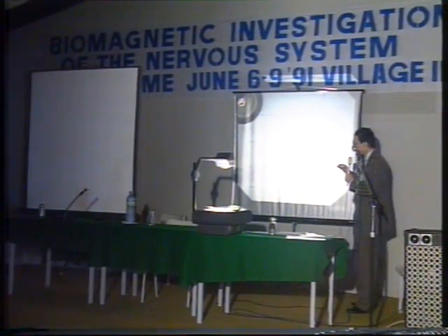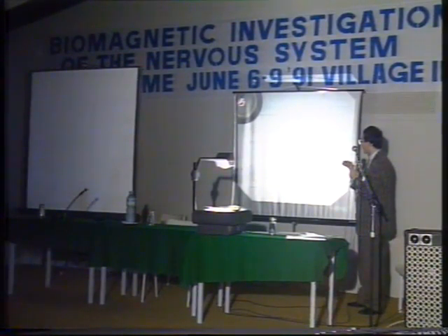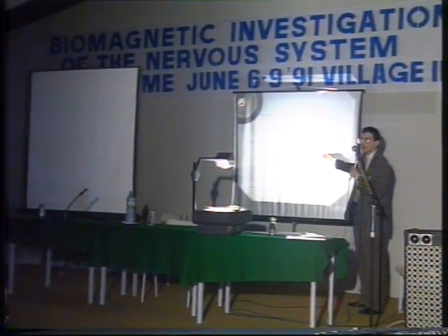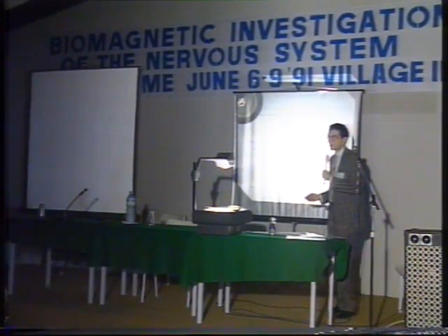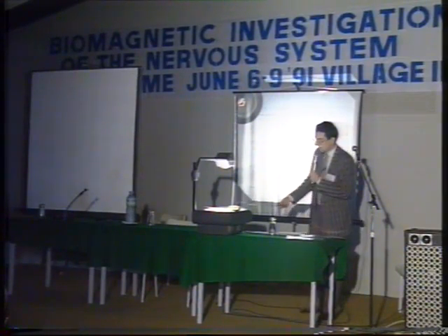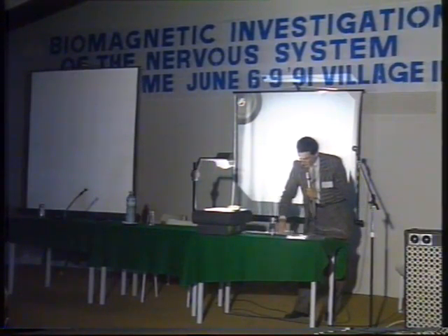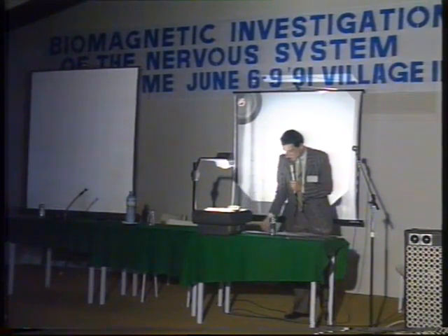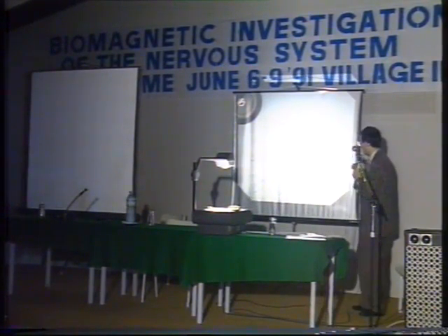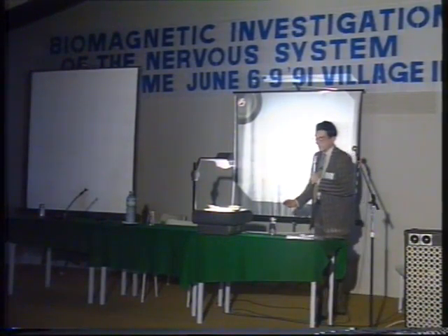Actually, we recorded the whole head also with left stimulation. So we also have data from the left side with left stimulation, but we just can't see anything because the generator is located in the right cortex. And this is the other side with the other stimulation, so left side, right stimulation. And again, I have this dipole here, and I can localize this as usual with the equivalent current dipole method.